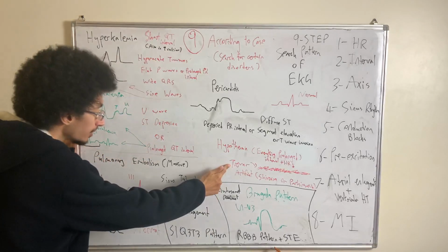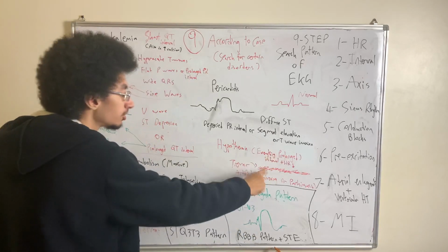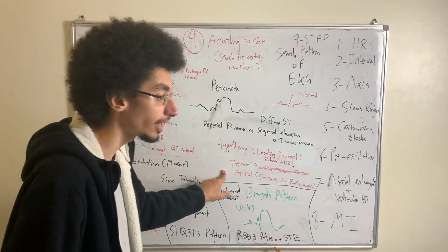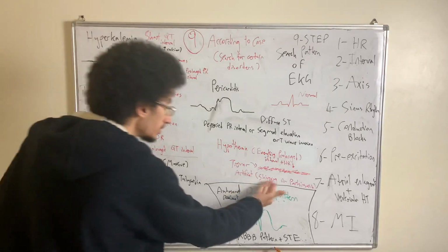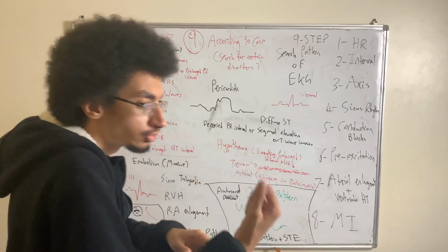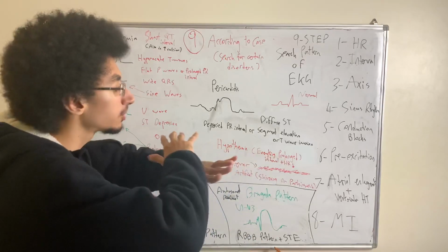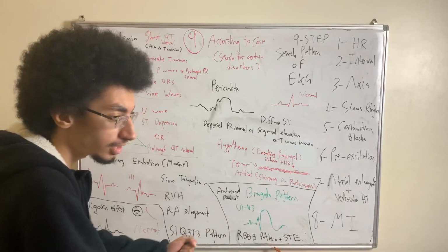And this will lead to a tremor artifact, which kind of looks like atrial fibrillation, but it's not. So you see these multiple waves going up and down, up and down, up and down. You see this diffusely. And this is indicative of a tremor artifact due to a person who's shivering in hypothermia, right? Or in people with Parkinson's disease or Parkinsonism, where they have a tremor, or a pill rolling tremor. And this will affect the EKG reading. It will give you a tremor artifact which resembles atrial fibrillation, but it's diffuse. You're not able to distinguish what's going on. It's just a problem with the machine due to the patient moving too much, all right?